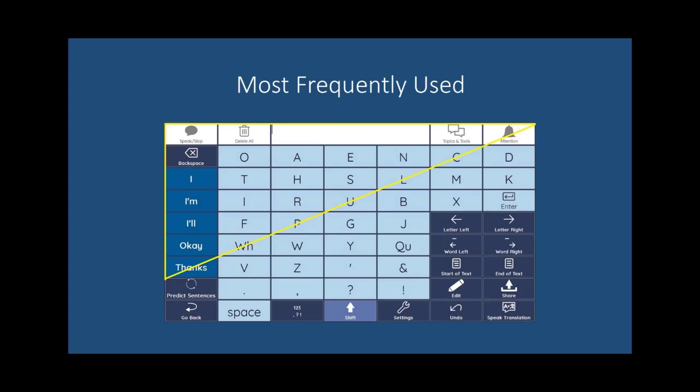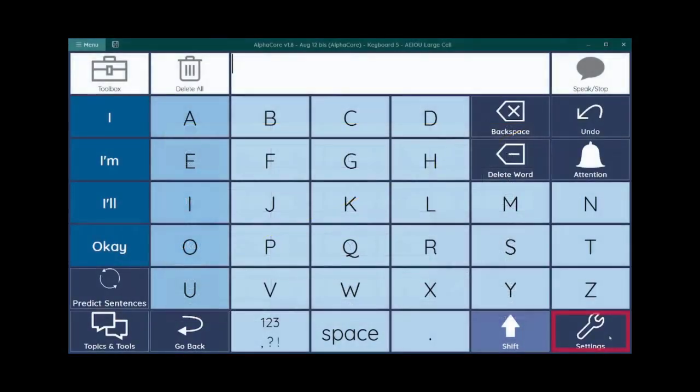The letters you will encounter most quickly during the scanning on this keyboard are letters that commonly appear in the first 1 to 3 characters of a word. You should not need to type more than that for most words to appear in word prediction.